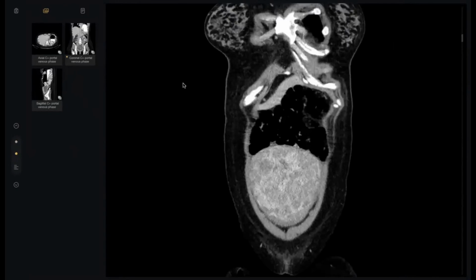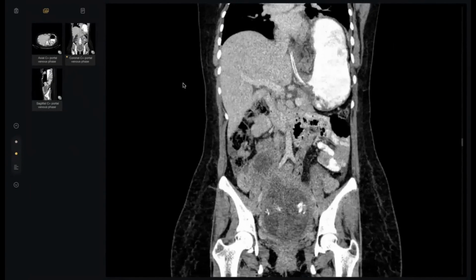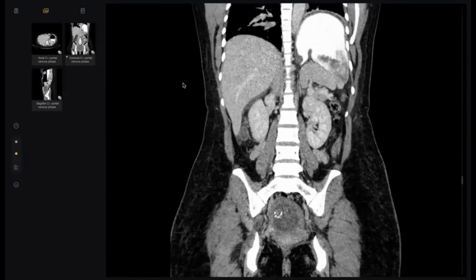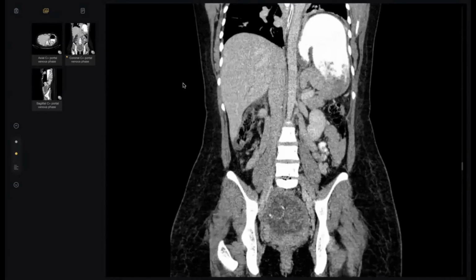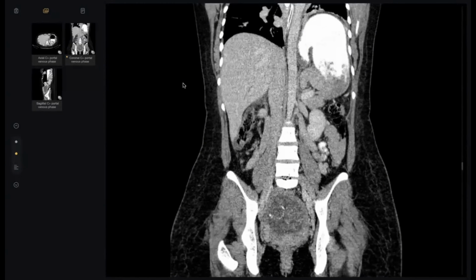Yes, this is gastric torsion. What type of torsion? It is organoaxial. Why? Because the long axis of the stomach is inverted.